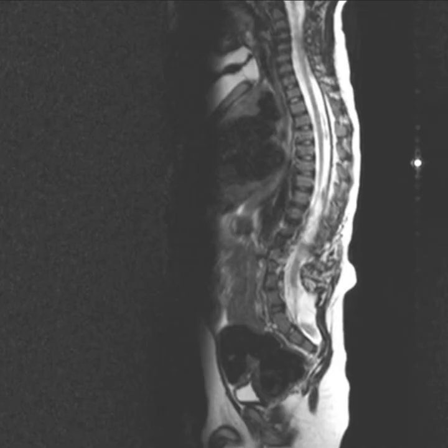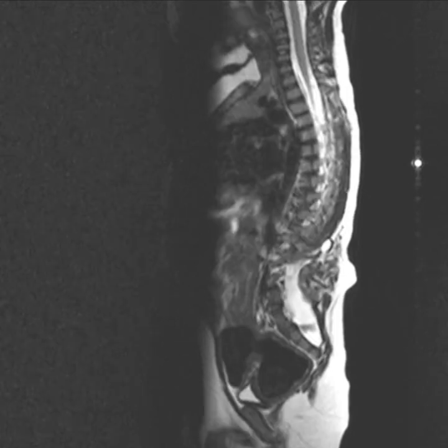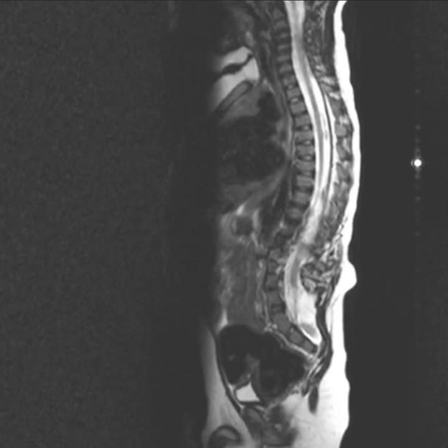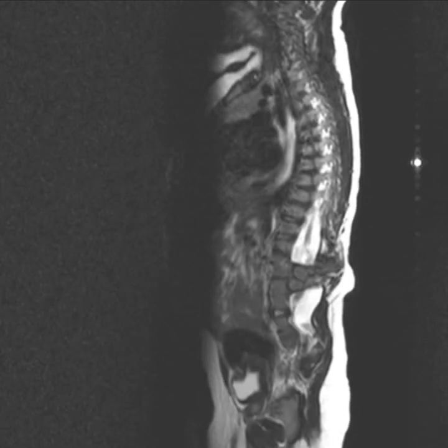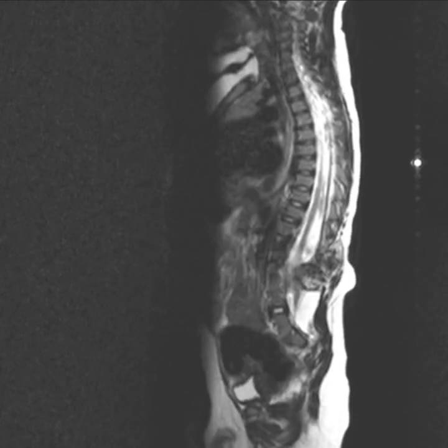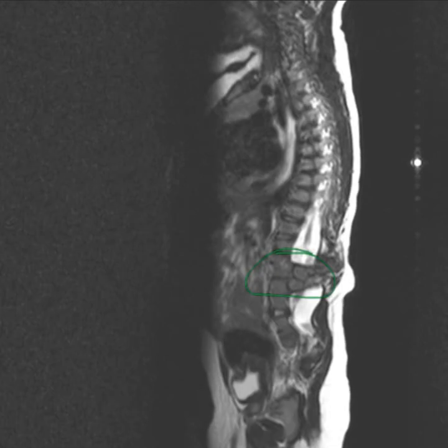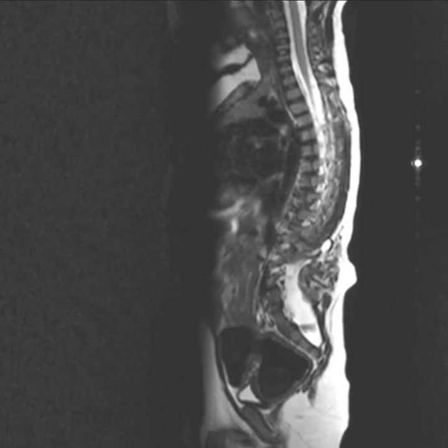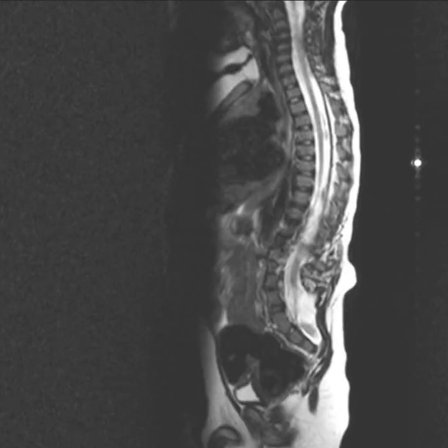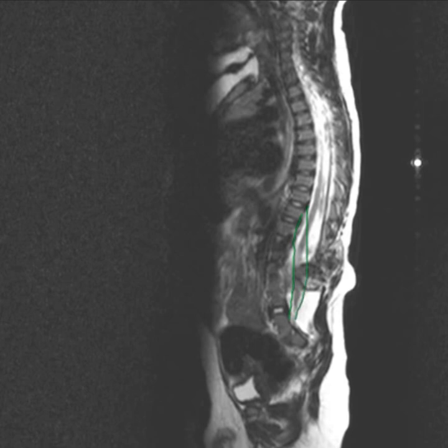Okay, so these are the sagittal images of the whole spine of this child, and we can clearly see there is some sort of vertebral anomaly at this level, and also it's obvious that there is a tethering of the spinal cord. We can see that the spinal cord is attached to the level of, I think, S1, and it's tethered past the area of the vertebral anomaly. We need to see more images for better evaluation.